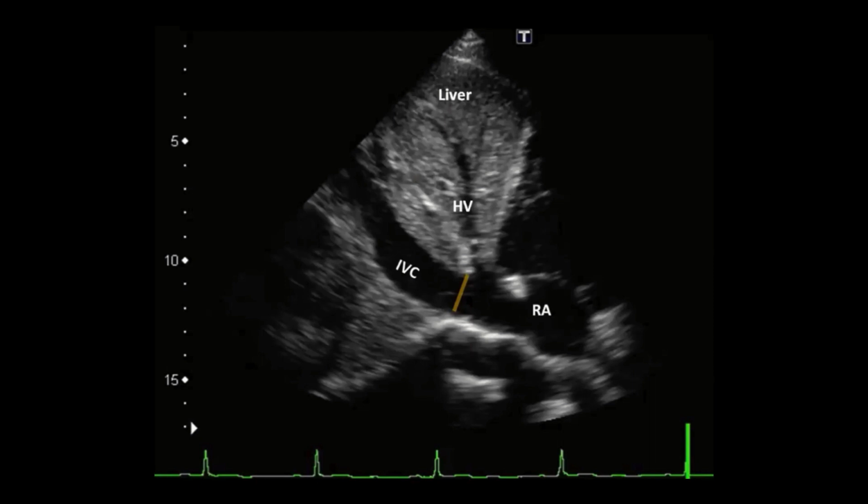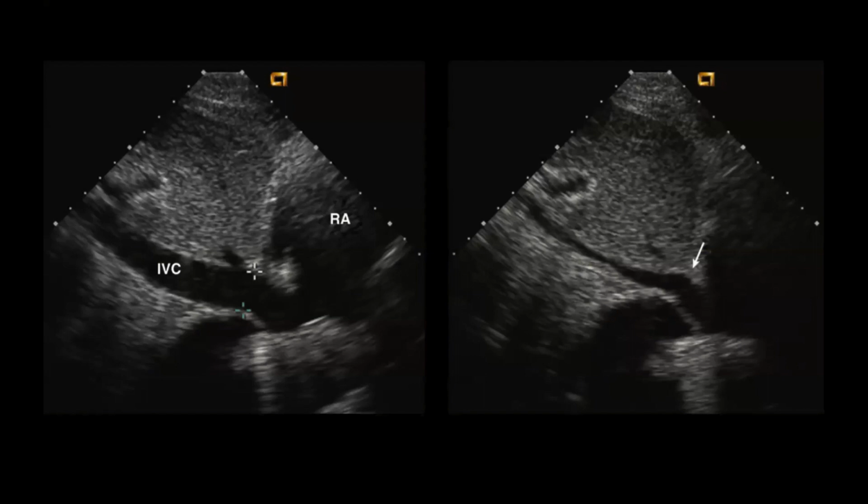The only problem is that some folks might be able to generate 100 centimeters negative pressure in their chest when you ask them to do a sniff, therefore collapsing a completely full IVC, while other patients, because of fatigue or poor mental status or abdominal pain, might do only a 5 centimeters negative pressure in their thoracic cavity, therefore not causing a collapse of the IVC when their right atrial pressure is actually on the lower end.